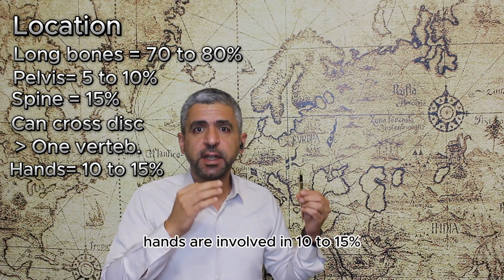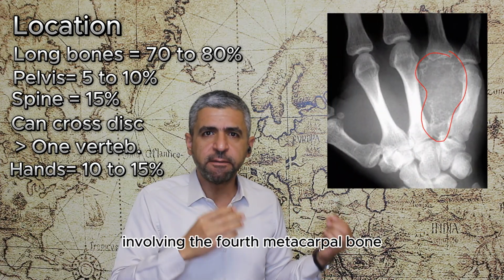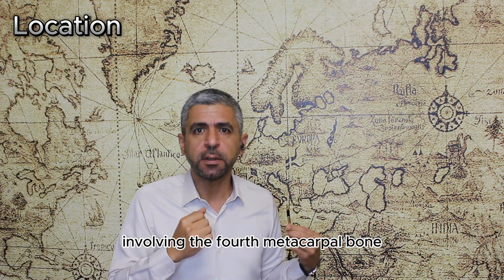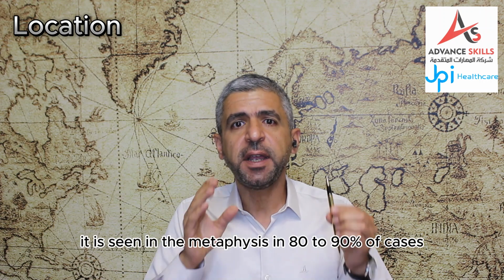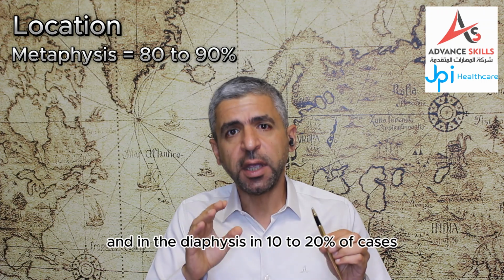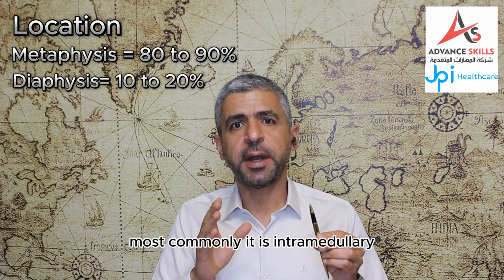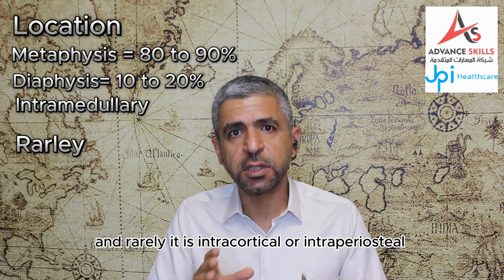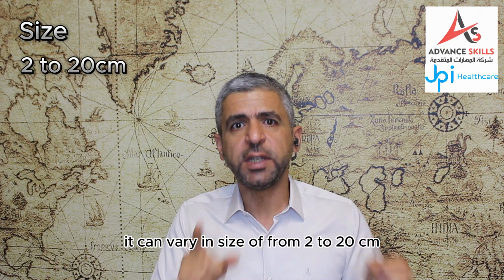Hands are involved in 10 to 15%, as in this case of aneurysmal bone cyst involving the fourth metacarpal bone. Regarding location within the bone, it is seen in the metaphysis in 80 to 90% of cases, and in the diaphysis in 10 to 20% of cases. Most commonly, it is intramedullary, and rarely it is intracortical or intraperiosteal. It can vary in size from 2 to 20 centimeters.